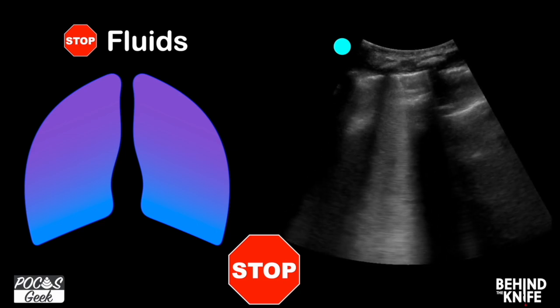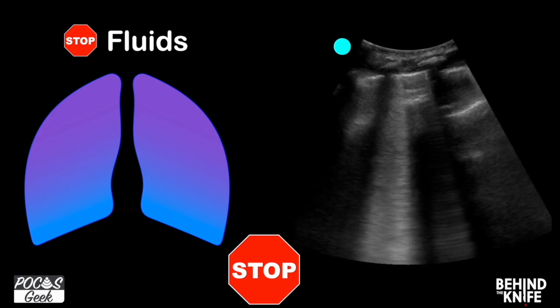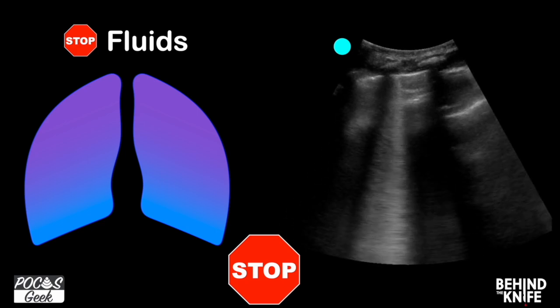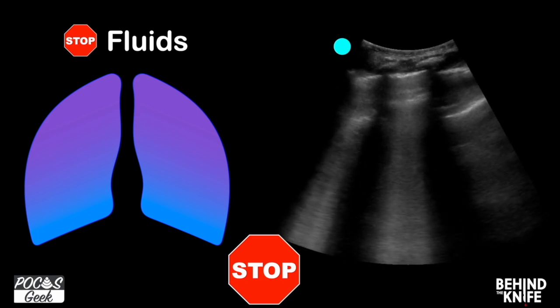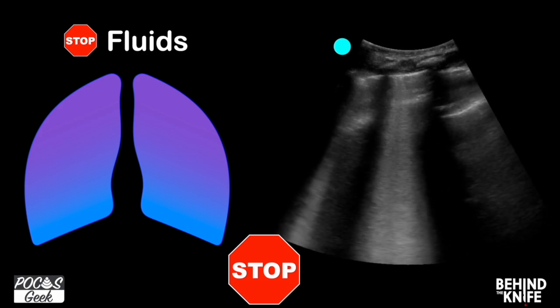Now, again, I'm going to state this over and over for lung ultrasound. We are not predicting fluid responsiveness. What we are doing is using lung ultrasound to monitor when third spacing is developing, specifically in the lungs, and that can be detrimental. So we want to catch it early.